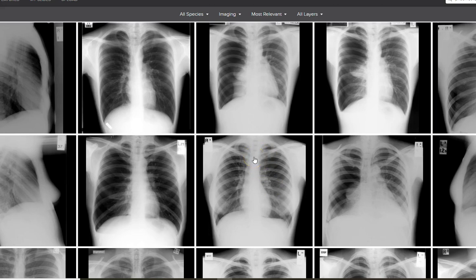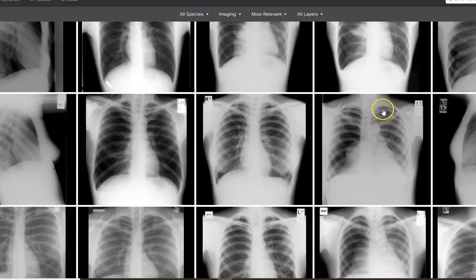And yes, I'm skipping, but I'm pretty used to looking at these things, so that's why I'm doing it. And like I say, when I see a new X-ray that I haven't Googled, I always go through my strategic approach. It's just I'm playing spot the pneumothorax here. Big pneumothorax here, potentially even a little bit of one on that side there.